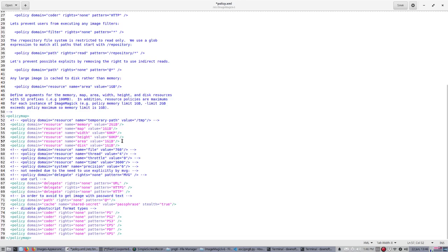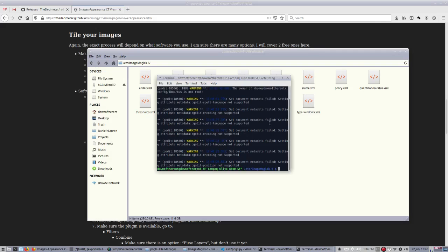I don't know. But yeah, now you can save that, and you can retry that montage function that we did earlier. That is, if it ever failed. But ours didn't fail, so we're done.